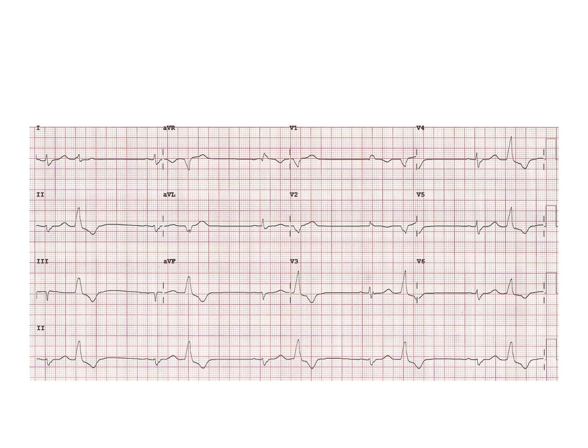Now going below the AV node, we come to the bigeminal rhythm, which is basically a normal QRS followed by a wide ventricular QRS. We don't really understand bigeminal rhythm well. Something has irritated the ventricle and it has made it respond.